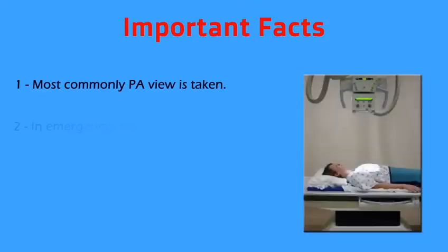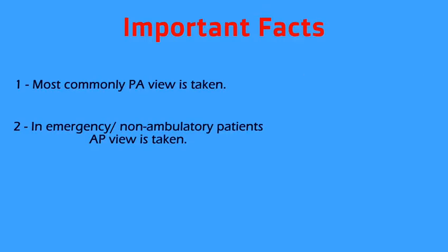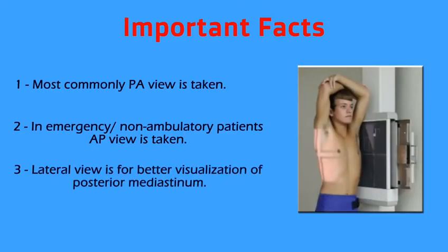In emergency cases or in non-ambulatory patients, we take the AP view or the antero-posterior view. Other views like the lateral view is taken for better visualization of the posterior mediastinum.